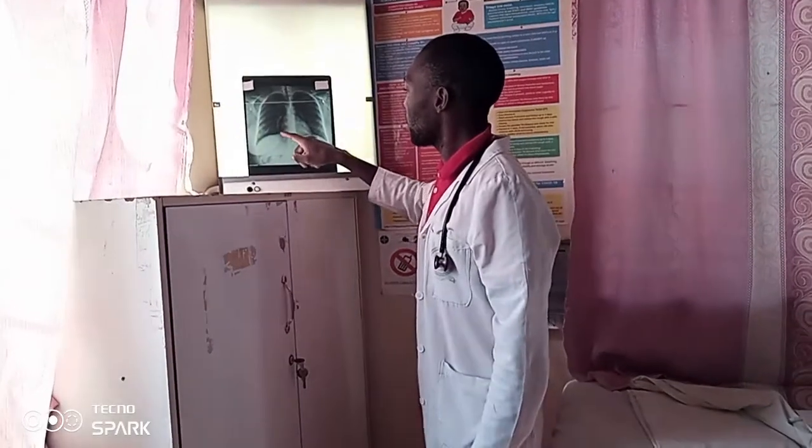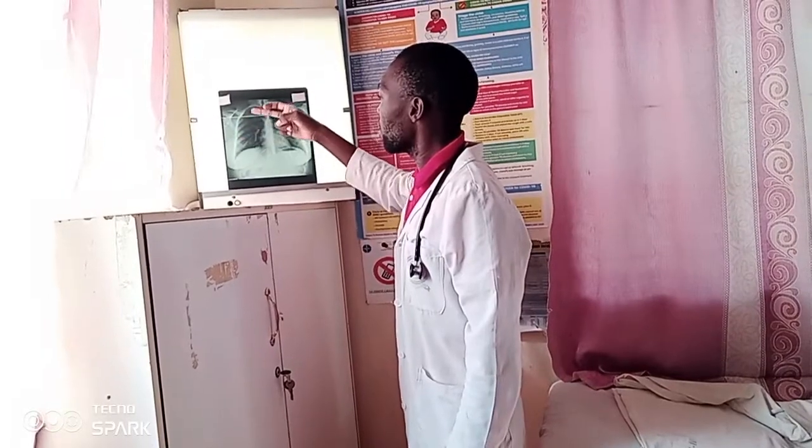So you take the distance between the costophrenic angles and the width of the heart, and if you find the ratio, you can find if the patient has cardiomegaly. For a good film, if it is more than 50, you see there is a cardiomegaly. You also check the lungs for opacification. If there is opacification of the lungs, you think of pus, you think of water, you think of blood, you think of tissues. If there is tissue injury, you can see it on an X-ray.